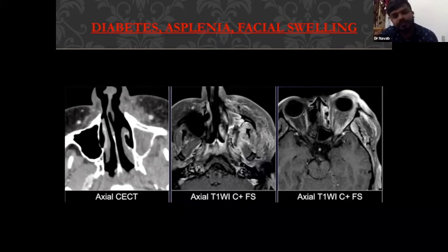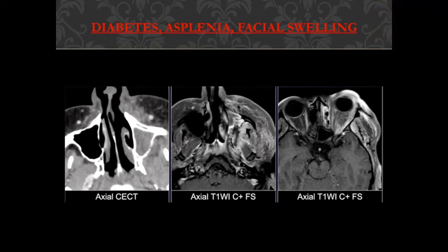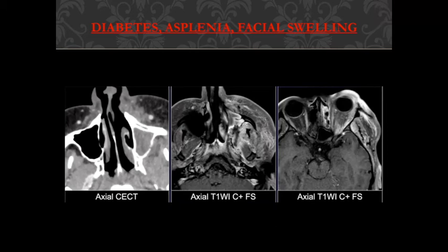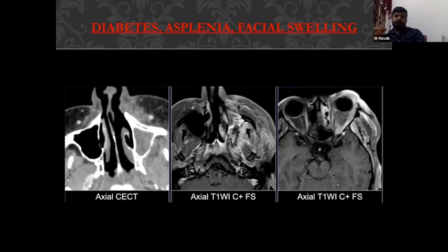There is also some retromaxillary expansion, right? Yes, sir. The posterior wall of the maxillary sinus shows some erosions. On contrast imaging, what are you seeing? Heterogeneously enhancing abnormality is noted, with a hypo-enhancing area. What is that hypo-enhancing area called? Black mucosa sign or black turbinate sign. What is that?